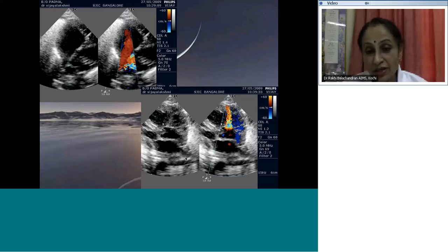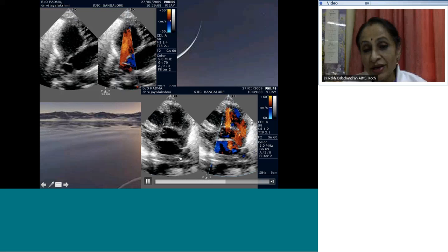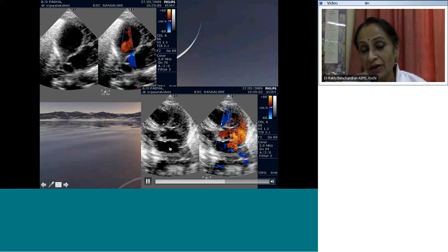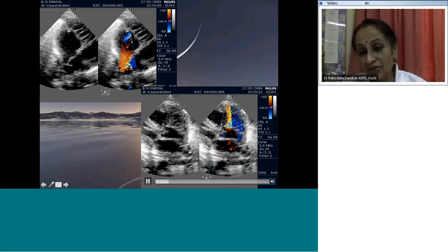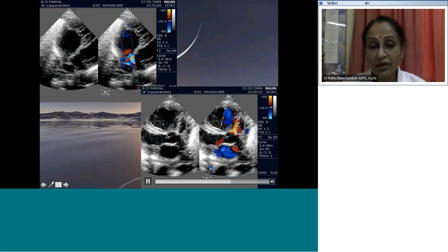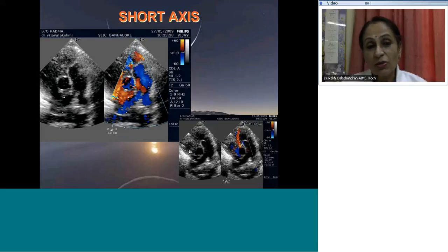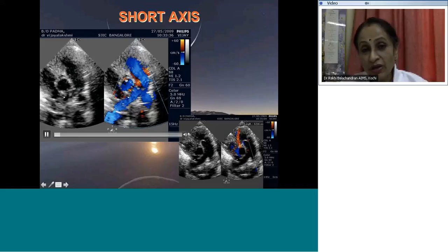So here you have an ASD, but what you notice is in the parasternal long axis, no pulmonary veins are draining into the LA. So LA is small, it's almost the same size or lesser than the aorta. LA, LV are small, pulmonary veins are not draining here, but they are draining elsewhere. So let's check here. There is also a subpulmonic VSD.